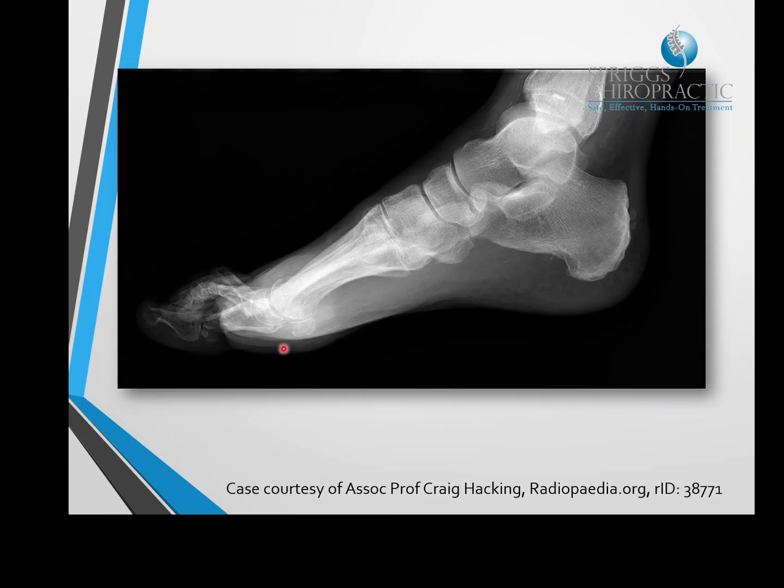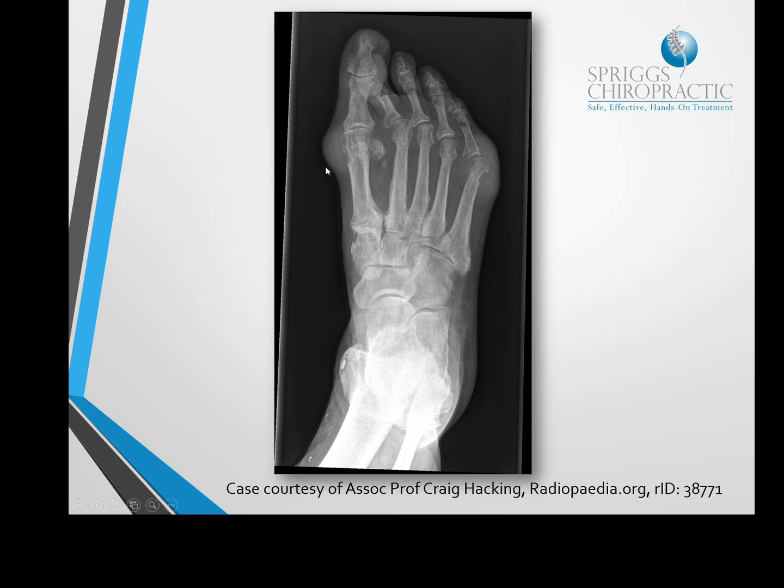So there's your giveaway sign that this is going to be involving this side of the foot. And here's the AP view, and we can clearly see again that soft tissue swelling as it extends outwards away from the joint of the big toe. Here we've obviously got some subchondral cysts forming as well, so that's pretty obvious. We've got some joint erosions going on, and it's the same in the little toe over here as well, where we've got quite large joint erosions.